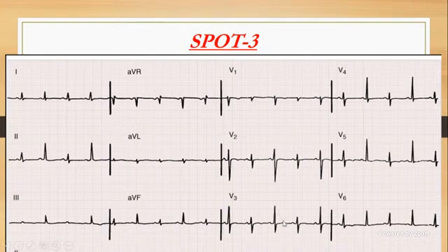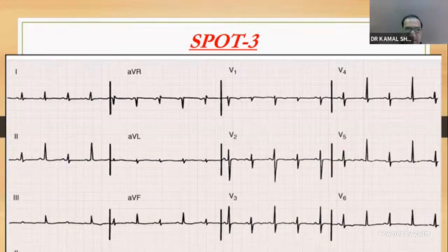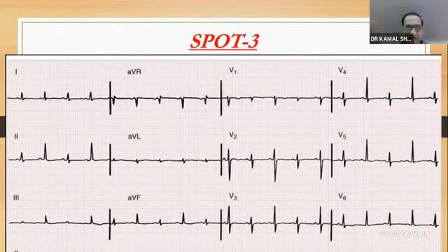Sir, should I try? Yes, go ahead, please, Sunil. Sir, 12 lead ECG showing sinus rhythm with heart rate of more than 100, around 110, 120. Axis, sir, aVL is equiphasic. So aVL is equiphasic, and lead 2 is positive, so axis is 60 degrees, sir. 60 degrees. Simple. You just have to practice this. There's no big deal, you can easily pick up the leads. Just keep practicing the axis in a couple of ECGs, and you do it instantaneously. Correct, 60 degrees. So that's fine.